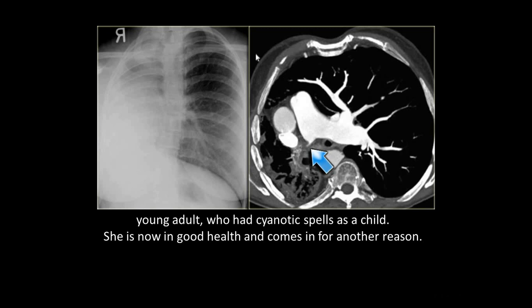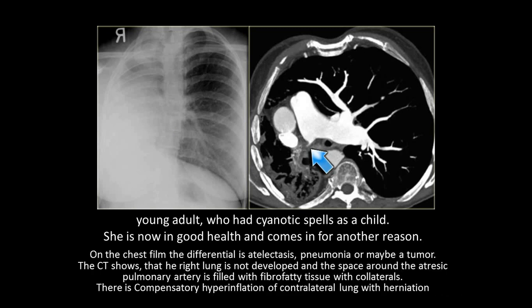The chest X-ray shows no discernible normal heart shadow, which means that the heart and mediastinum are deviated to the right side, right? What will cause deviation of the mediastinum to the right side? Either a collapse on that right side, or a contralateral tension pneumothorax. But in this case, it's most likely a collapse because of the white hemithorax. And the left hemithorax is seen to be okay, right? So it could be atelectasis, pneumonia, or maybe a tumor that is causing collapse here and deviation of the mediastinum toward the right side.